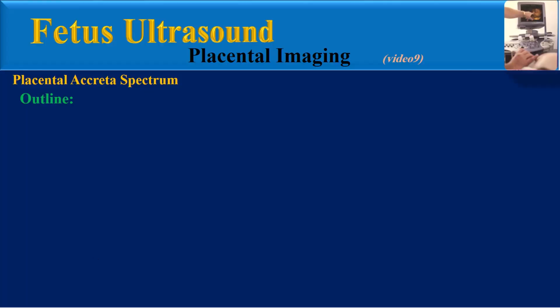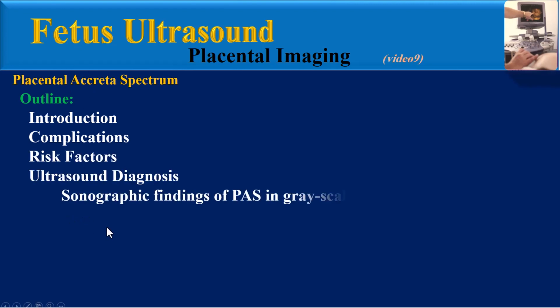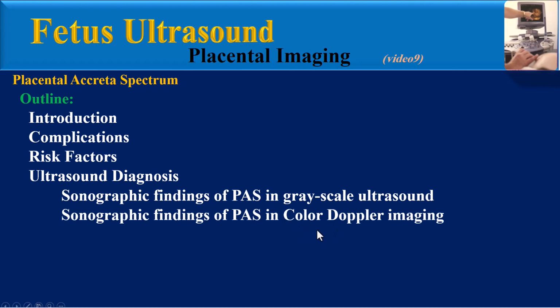The outline of this presentation includes introduction, complications, risk factors of placenta accreta, ultrasound diagnosis, including sonographic findings of placenta accreta in grayscale ultrasound and also in color Doppler imaging, ruling out placenta accreta spectrum, and final teaching points.